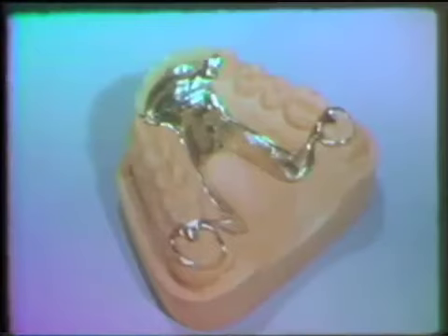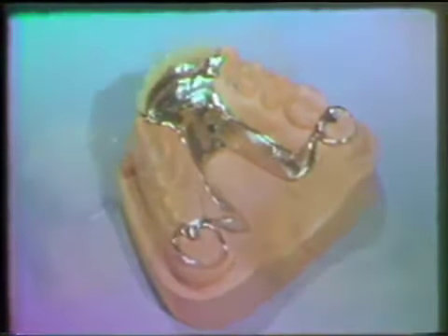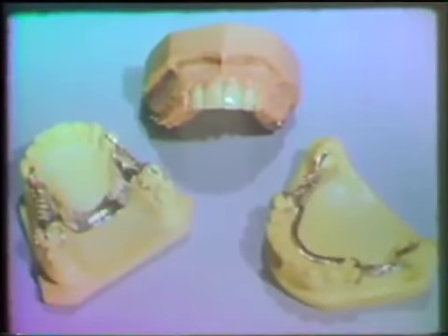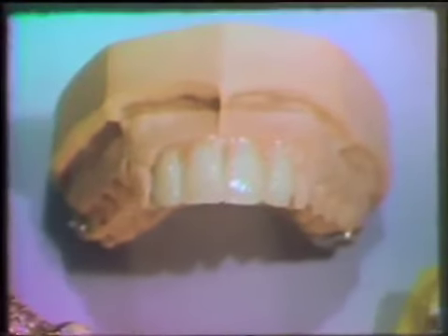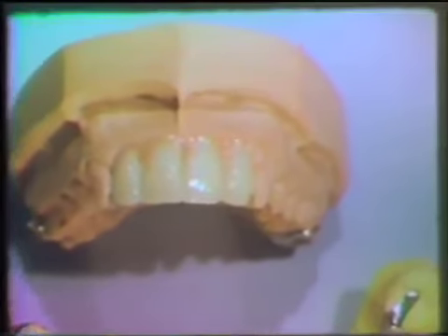Part 1 in this two-part series of films will consider the use of the rotational path concept in the maxillary class 4 partially edentulous arch. Part 2 will describe its use in the maxillary and mandibular class 3 partially edentulous arches. These are the three most common situations in which it may be most effectively utilized. At the end of the two films, the viewer will be able to describe the rationale and indications for the use of the rotational path of insertion and identify its advantages and disadvantages.